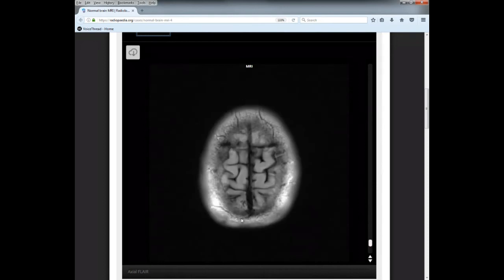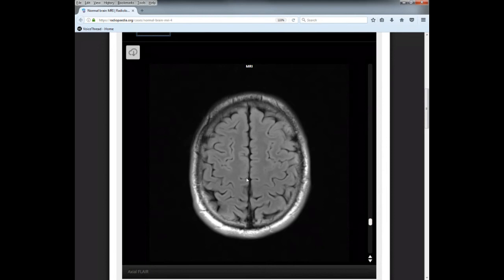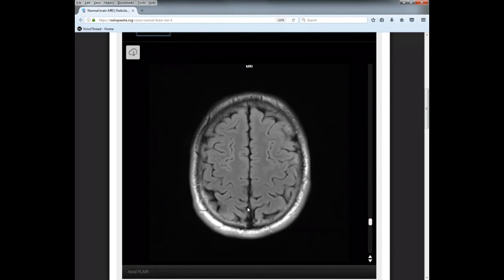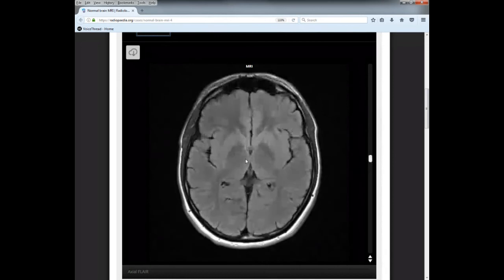So go up to the top of the skull, go to the apex of the skull, and now start traveling down. And I want you to look in the posterior aspect of the brain, just to the lateral aspect, I guess, of the longitudinal fissure. So here's your longitudinal fissure, your main fissure right here. Okay, separates your brain, your cerebrum, into right and left hemispheres.